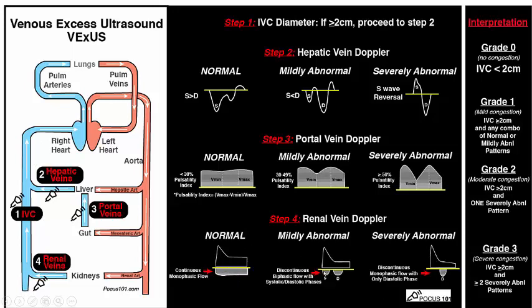First, in mild abnormality, you will see the systolic wave separated from the diastolic wave of venous flow, and if too much abnormality, the systolic wave will become upright, like the systolic wave here in the hepatic vein, and will be masked by the arterial wave here, and you will see only one diastolic flow. So if you see separated systolic and diastolic flow, it's mild abnormality. If you see one diastolic flow, it's severe abnormality.